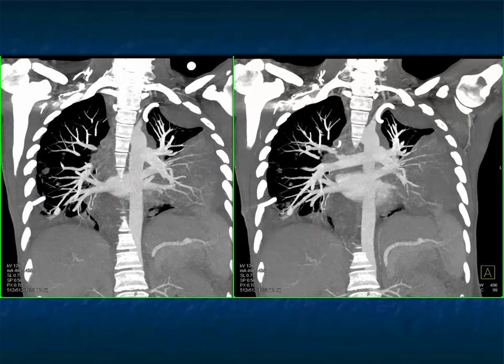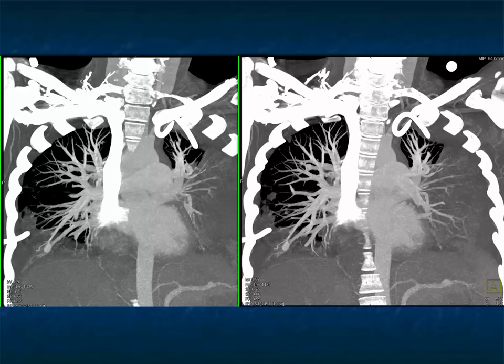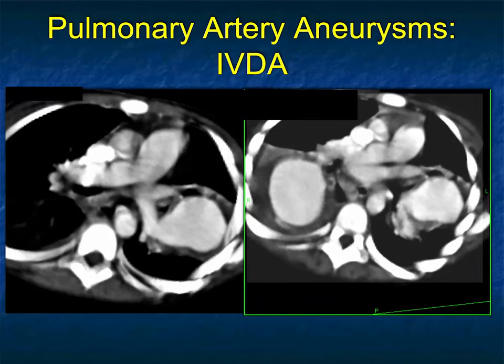And here's just a few more reconstructions very nicely shown in this example. And again, the effusions which are infected, as well as the patient's aneurysm, right lower lung. And again, some additional 3D MIP imaging showing you that.